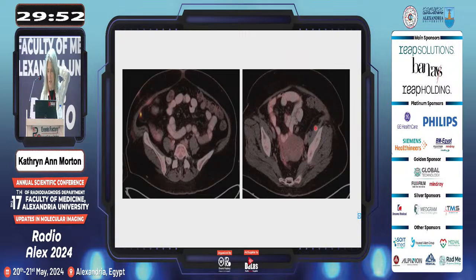So ovarian masses, how you take them out: a mucinous ovarian neoplasm is a big problem. People would like to take them out laparoscopically, but there's always a risk of it spreading. And if you even drop a little bit into the peritoneal cavity, sometimes you convert a patient from a curable tumor to one that is spread intraperitoneally, as happened here. This patient had a laparoscopic removal of an ovarian neoplasm that proved to be cancerous, and this was a follow-up PET scan with a rising CA-125, and lo and behold, there was a metastatic lesion within the mesentery near the site of the laparoscopic port.